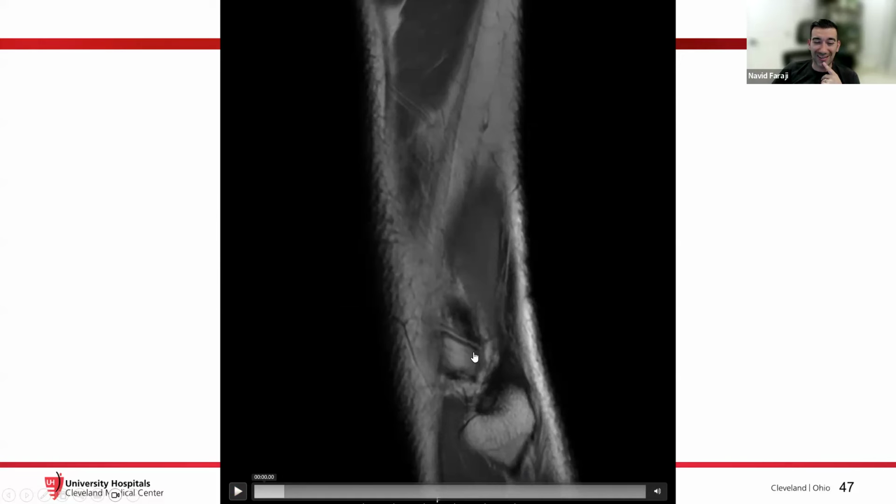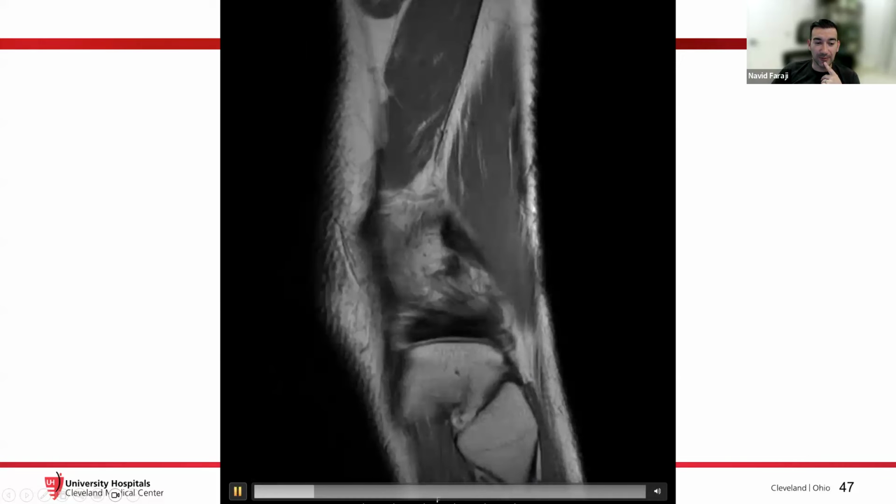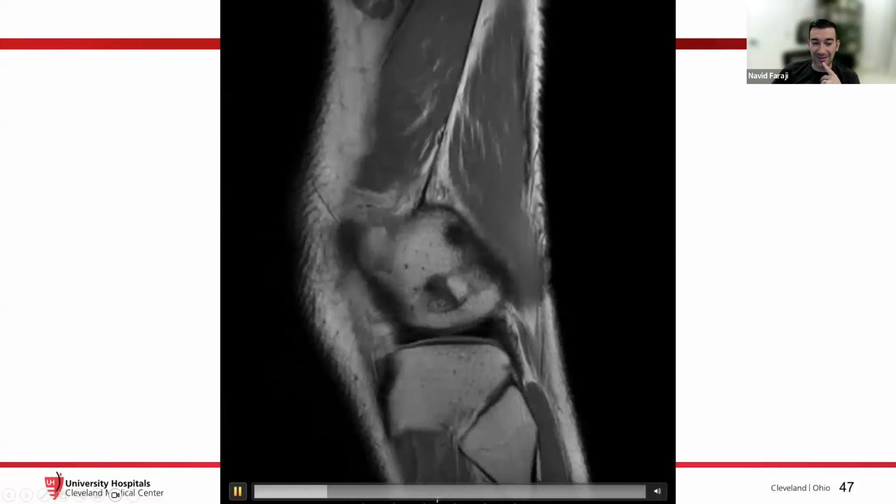We're seeing this black thing. You can probably guess that is your lateral collateral ligament or fibular collateral ligament that we're slicing through right there. And then we're slicing through our IT band, which is inserting onto Gerdy's tubercle on your tibia. We're starting to see a little bit of lateral meniscus body segment.